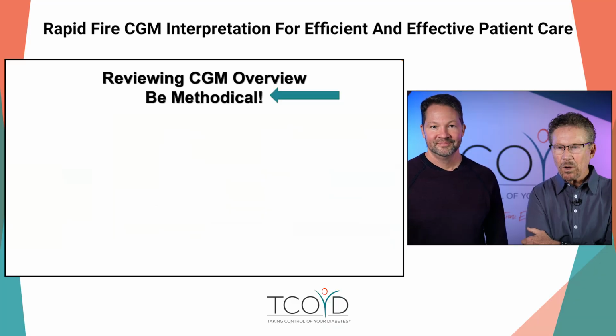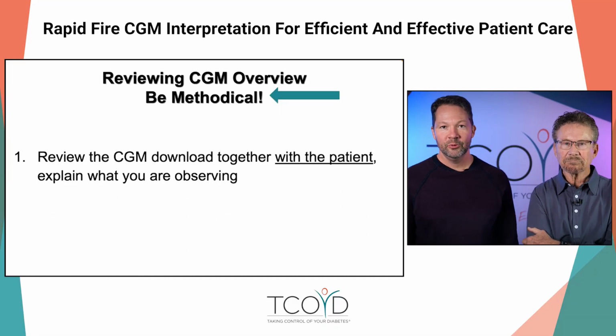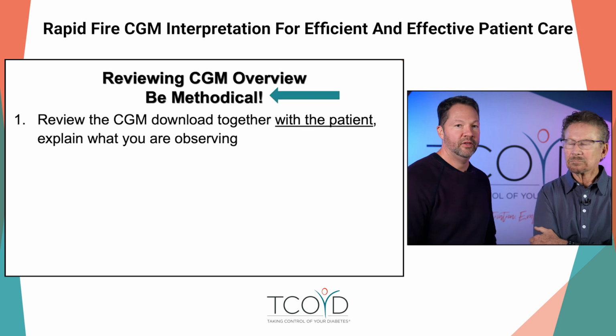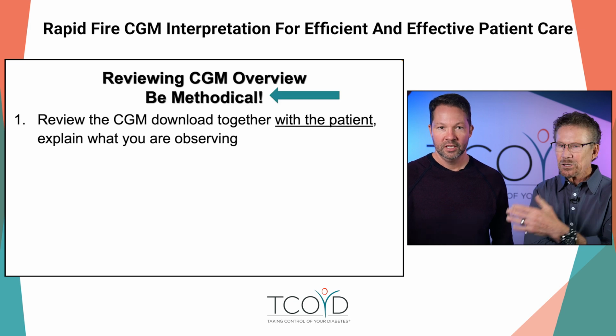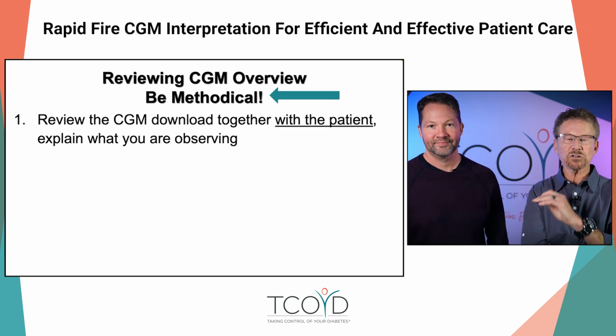Okay, well, all right, so my turn. How to review a CGM overview and being methodical. Once you do this, honestly, 3 times, it just becomes second nature and you can do it so quickly. You're going to see how he reviews the cases that he's never seen before.